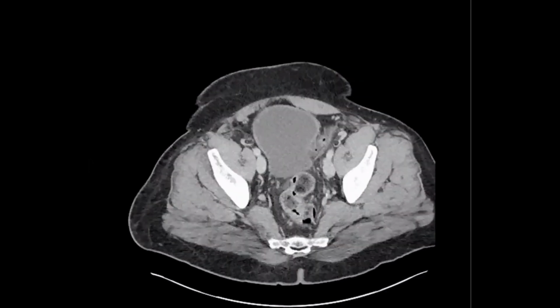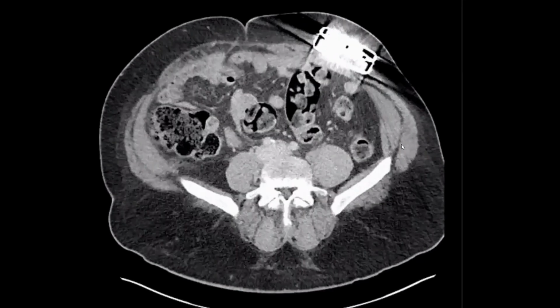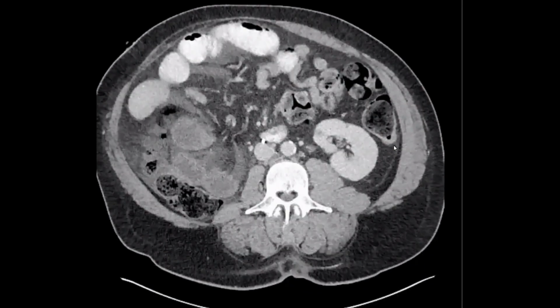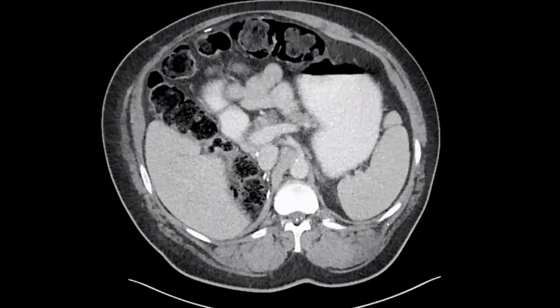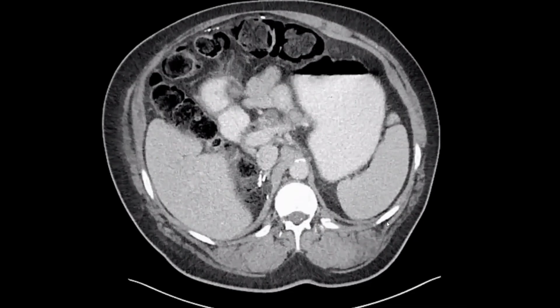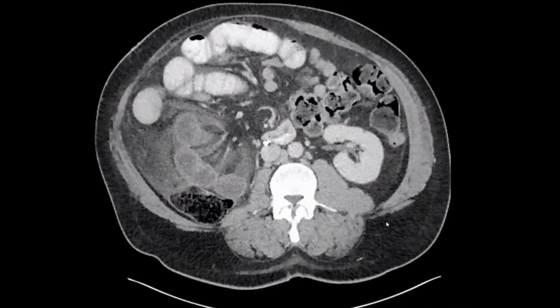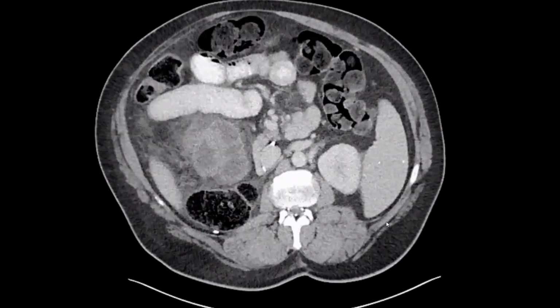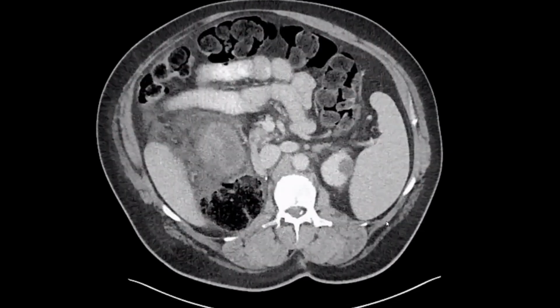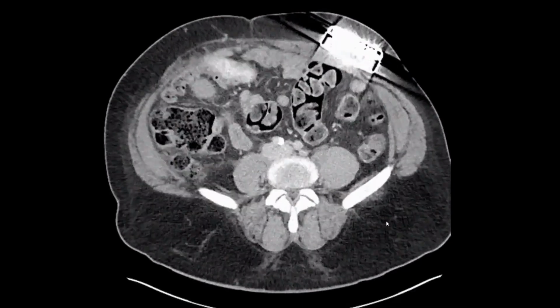Candidate number 10. Okay, abdominal pain. This is a very interesting case and full of many teaching points. Okay, go ahead. These are axial slices of the CT abdomen in the portal venous phase, in which I cannot appreciate the right kidney. There are dilated bowel loops that show two transition points.